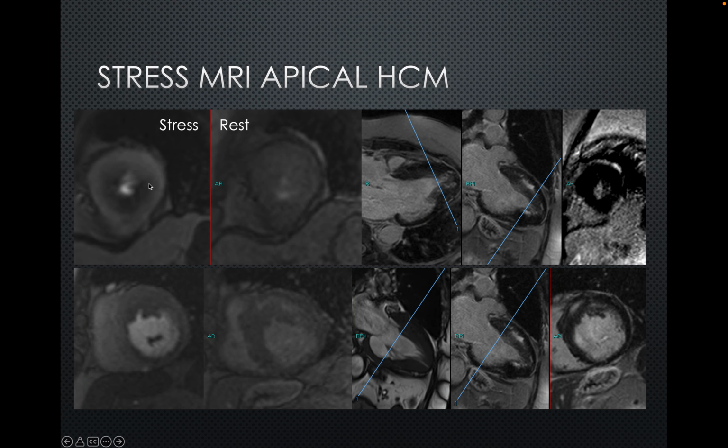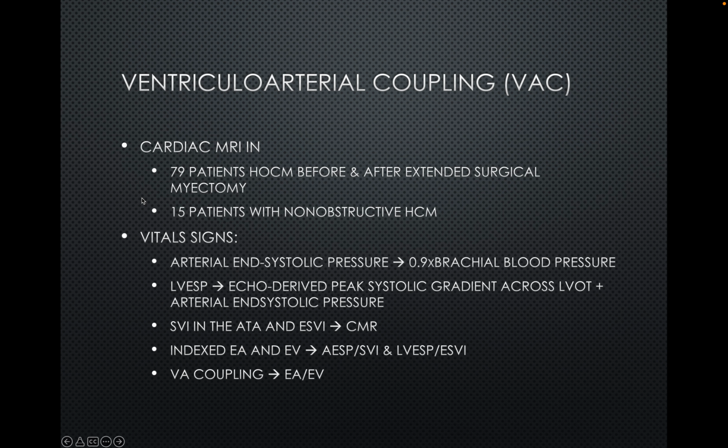Stress also: as you may see here, this is the stress study and this is the rest. There is a subendocardial perfusion defect in many territories, which correlates with subendocardial or microvascular dysfunction. In the literature they describe the importance of detecting microvascular dysfunction in HCM in order to predict cardiac events.